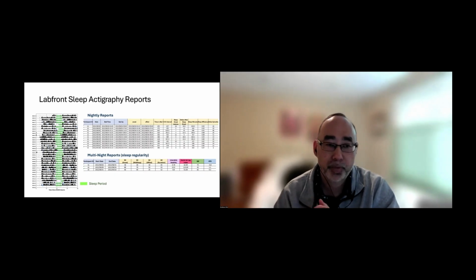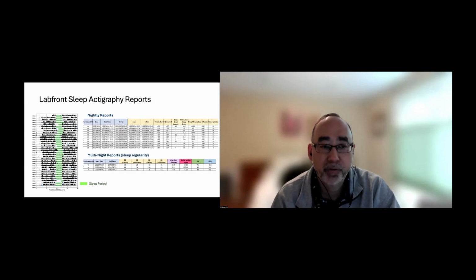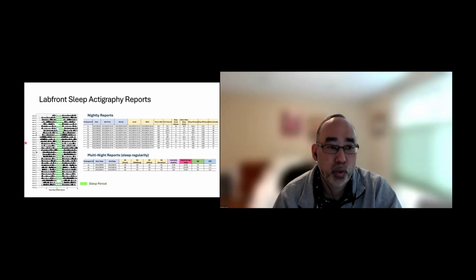For the future, what we really like to do at Labfront is to create a detailed actigraphy report. Again, this is a raster plot that was generated by an individual over the span of a month, and you could see the sleep patterns throughout the week. We can obviously generate nightly reports where you could talk about sleep efficiency, time in bed, etc.